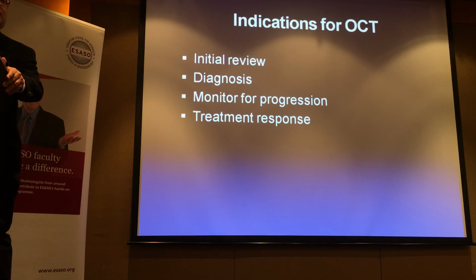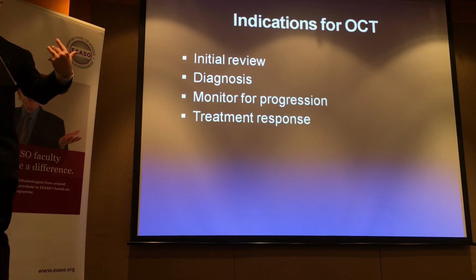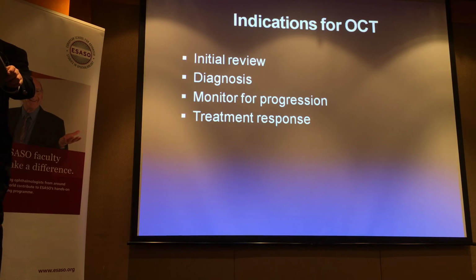It may be apparent clinically, it may be apparent on other tests that I will do, but usually after clinical examination, the next thing I'll go on to is an OCT, and if necessary, then an angiogram. So with the OCT, I may be able to at least have a good sense of the diagnosis, and the angiogram gives me different information. We'll talk more about that during the multimodal imaging aspect. But it's certainly helpful. And even if clinically I'm convinced of the diagnosis, I sometimes want this as a baseline to see how this changes.